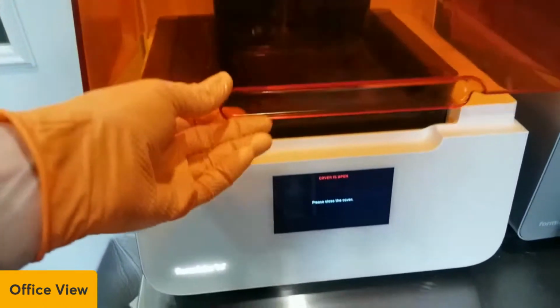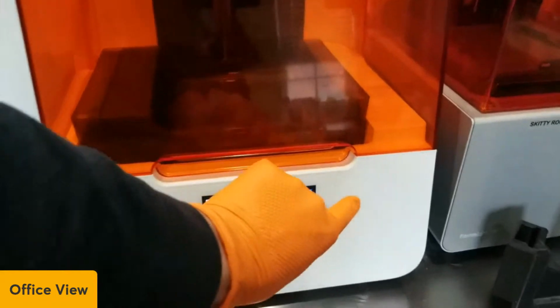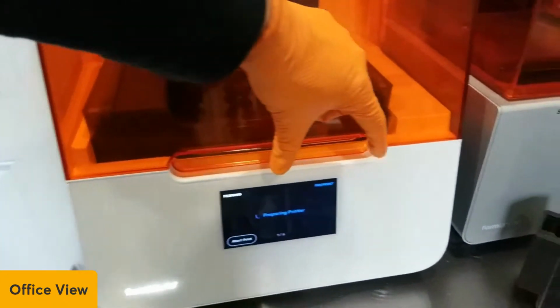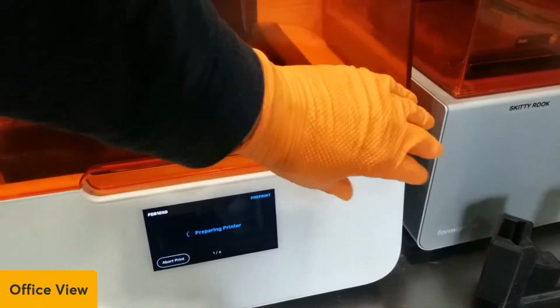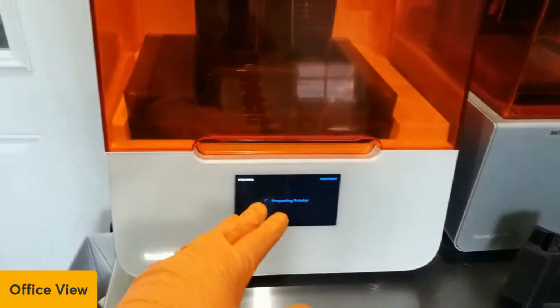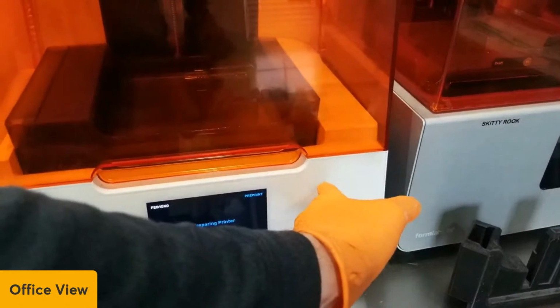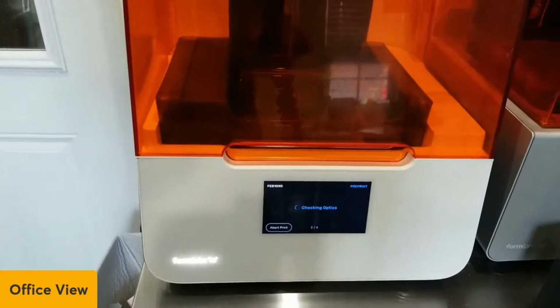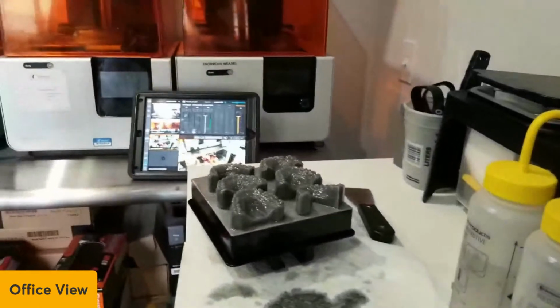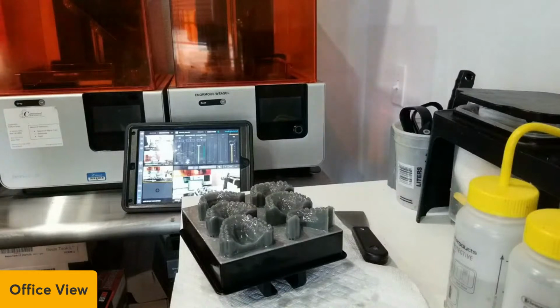I do like these Form 3s. The actual laser section they call it a garage. It can go into a garage and helps with dust and stuff. So obviously we work in a lab, it's very dusty. So this will actually tuck away into here, into this side compartment over here, the unit that slides back and forth. And so I think that's pretty cool. All right, so let's get to doing this. And I'm going to show you a couple tricks I have for removing models.